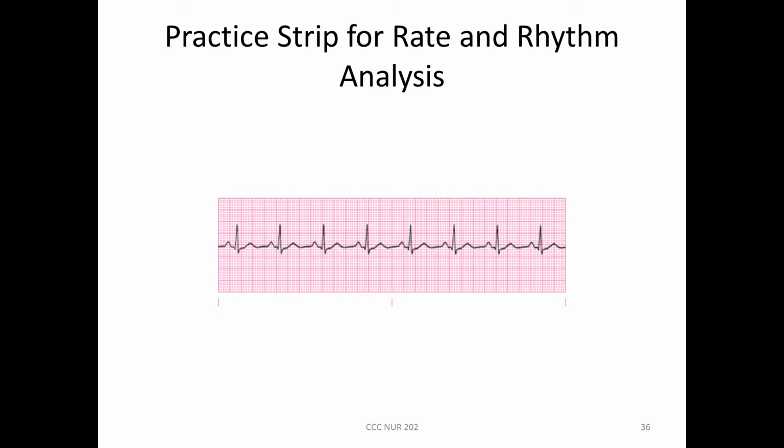And then right here, now you can do your P waves or your QRS again.